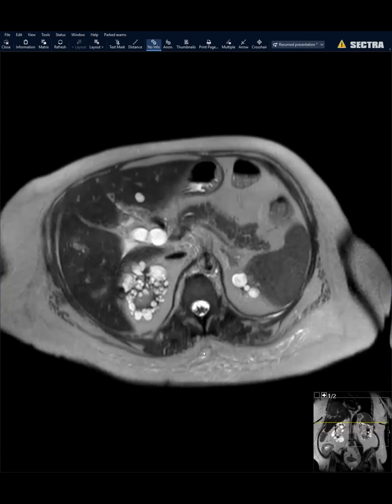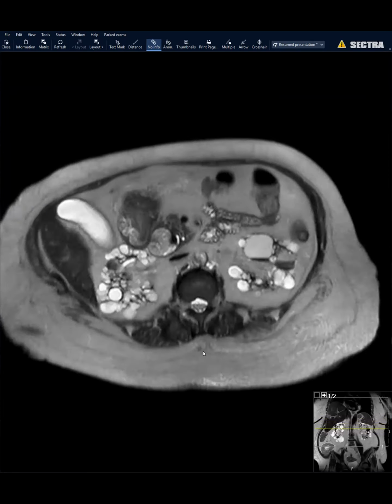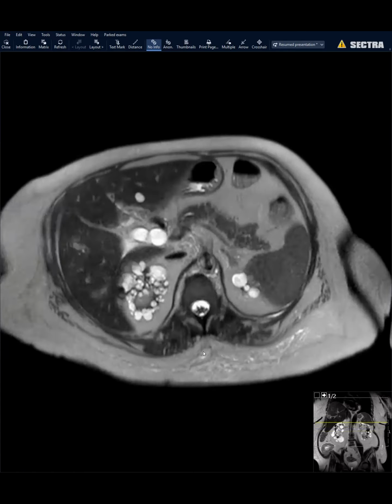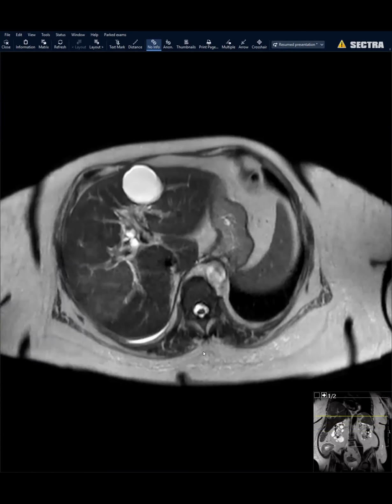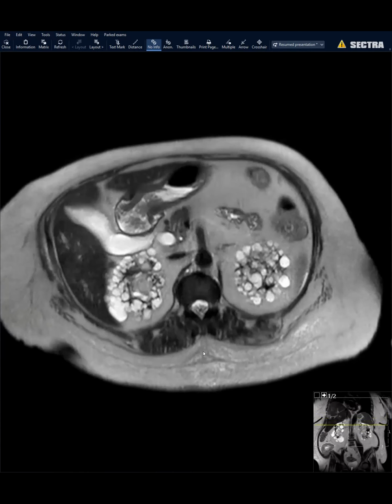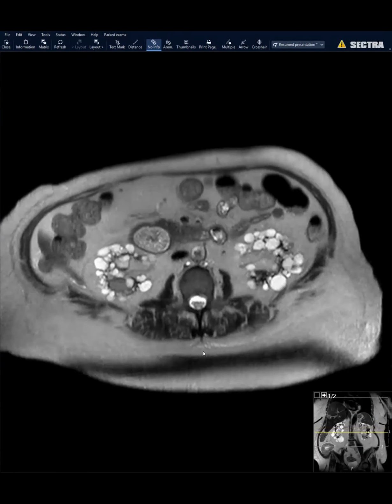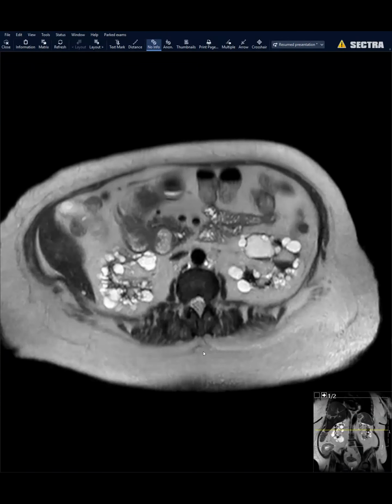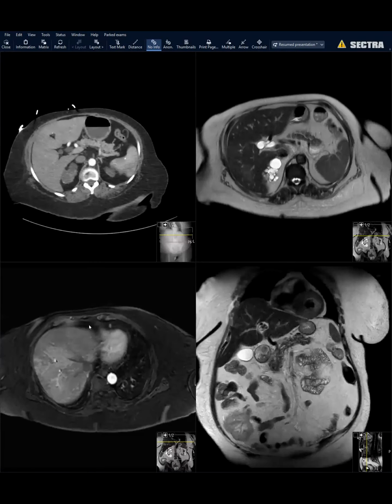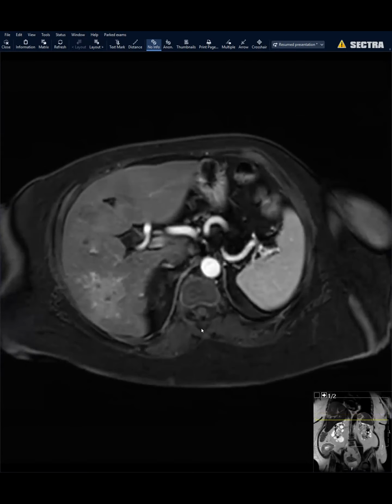And then what do you think of the biliary tree? The CBD is a little bit dilated centrally. Intrahepatic, there is dilation, and then it kind of tapers. I don't see a lesion necessarily in the distal CBD, but it tapers. Okay. And this is kind of tough to see, and I'll show you post-contrast as well, and we'll come back to some more images. So agreed, there is biliary dilation.